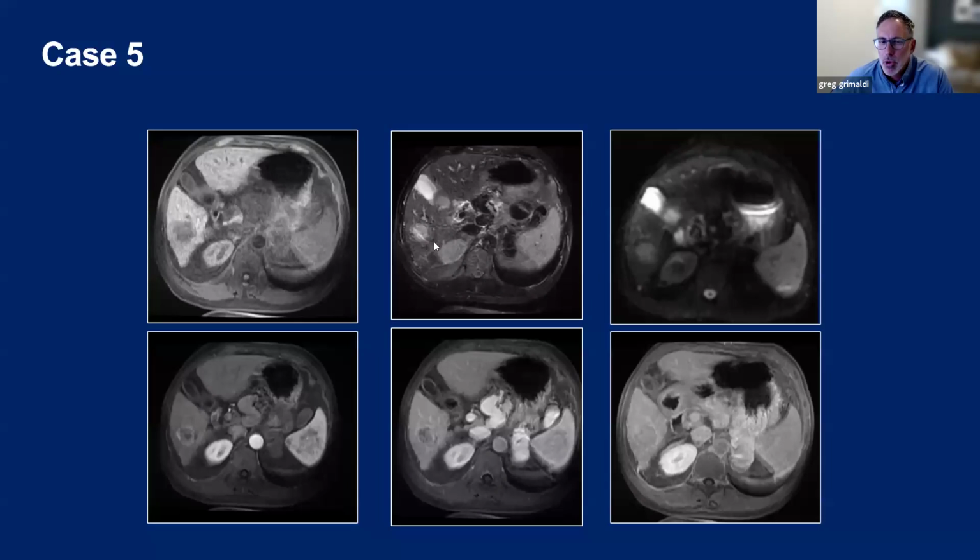They tend to have a little bit more T2 signal than HCCs. They tend to have marked restricted diffusion. They tend to have peripheral early rim enhancement, and they tend to fill in, but not homogeneous and hyperintense to the background like a hemangioma, but just tend to fill in because they have fibrotic tissue within, and fibrotic tissue enhances in a delayed fashion.